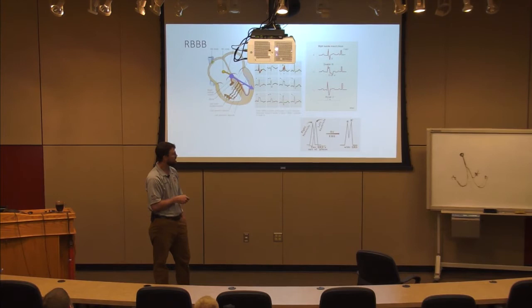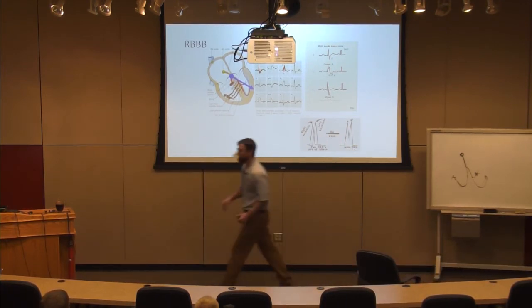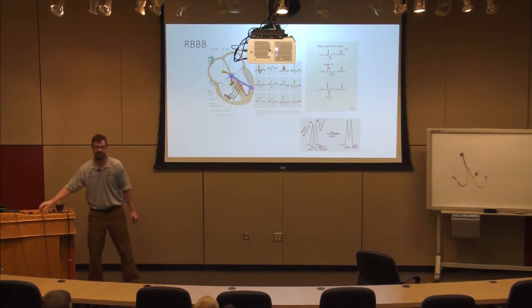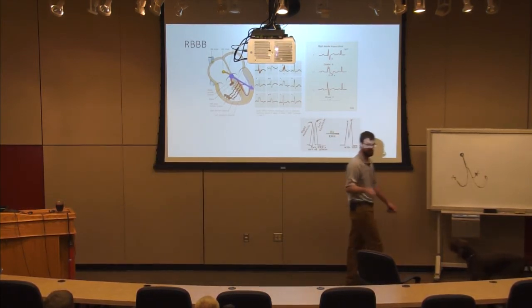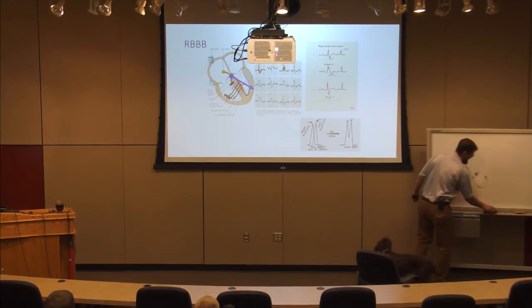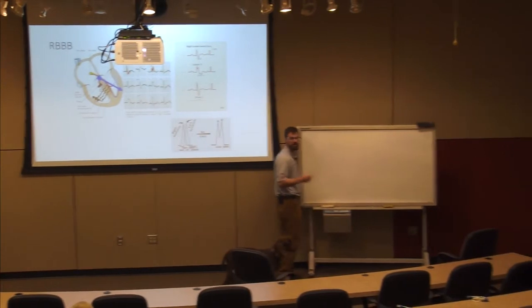So I have two events, a rapid fast event followed by a slow event, and you can tell by the slope of that QRS where it's at. So when I'm looking at a bundle branch block, one of the ways I can differentiate disease pathology that is tox or something purely ventricular in origin, like VTAC, is to look at that initial slope.